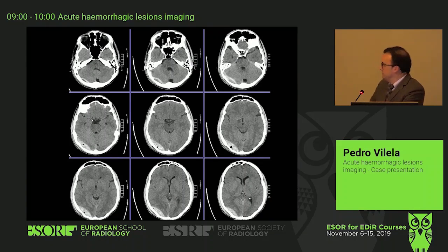So in the right occipital region, there is a lens-shaped area of hyperdensity with some air bubbles within and irregularity of the overlying bone. It does not seem to cross midline, but it does cross down into the posterior fossa, and is in keeping with an epidural hematoma with an overlying fracture.